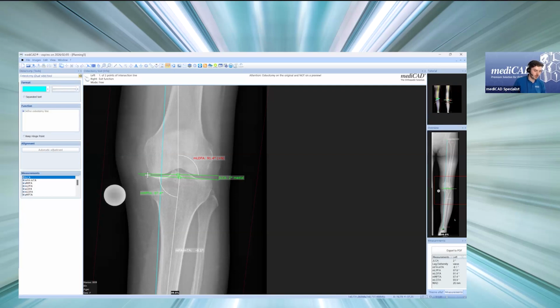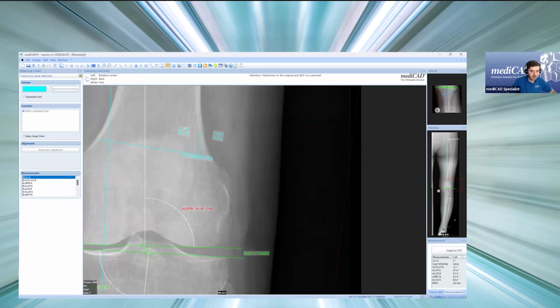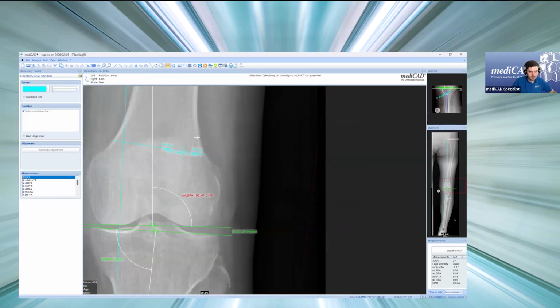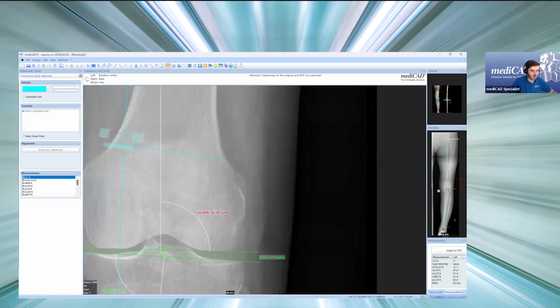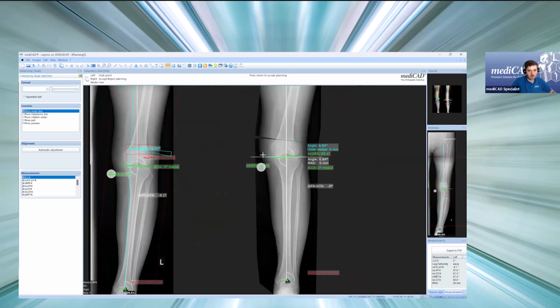So what we did for this version to make that a little bit more understandable, now if you set a cut and you have the, I know it's sometimes hard to read, if you have rotation center right here for the placement, you can see here, it will tell you, one, how big the wedge is, and depending on position, closed or open wedge. So if you set it here, closed wedge 6 millimeters, you can see we got a closed wedge DFO osteotomy with a wedge of 6 millimeters.